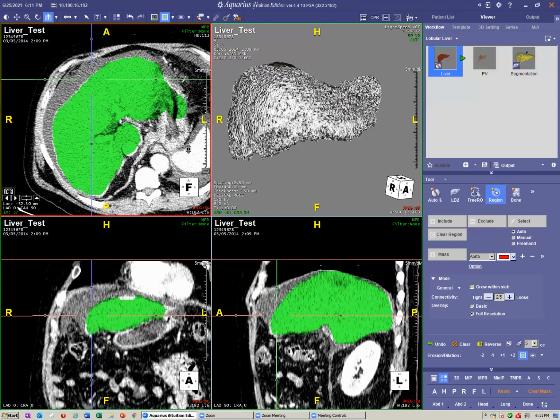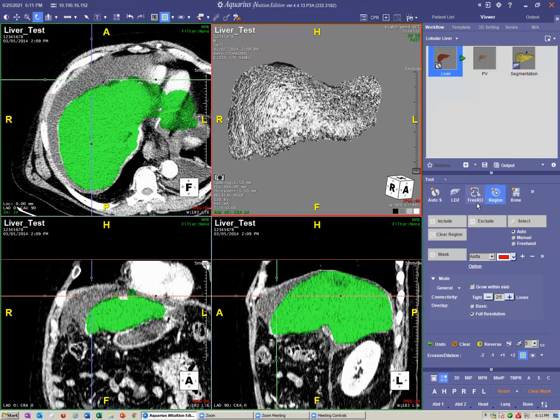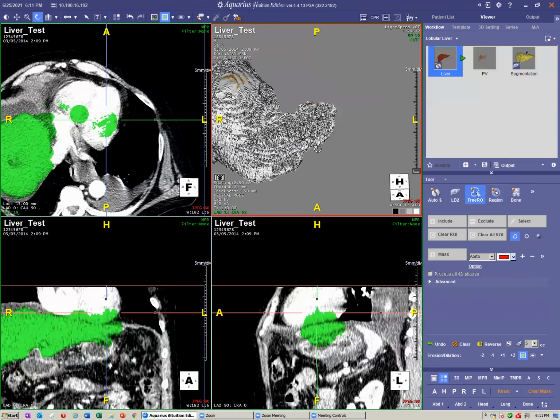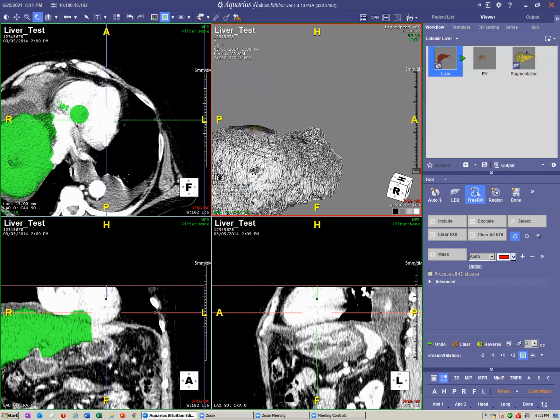All right, so here I missed some, cut out some liver there. We can use auto and highlight those areas, Control Shift left click, and then include. You can use the free region of interest as well if there's something really obvious. Let's see, I'm going to alt left click here. That's, I think, a lot of heart over here. Let's pretend this is all heart. You can shift left click and highlight the area you want to erase. By default, it's going to erase whatever you highlight throughout that area.